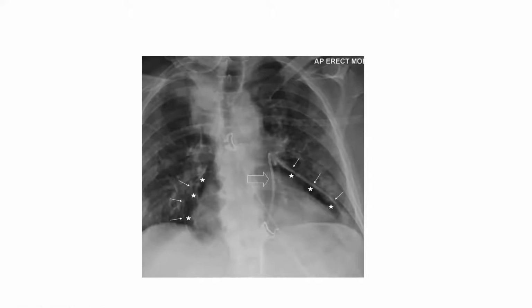So, ladies and gentlemen, anytime you lose my sound, please let me know, because I'm in a place where the connection is not stable. So, is my sound clear so far? Yes, it is clear. Okay. So the fluid goes dependently down by gravity, and the air goes dependently up. If you have air, it tends to go up. If you have fluid, it tends to gravitate down. That's why you have more air here than on this side, and of course, than in the inferior side of the heart. That's why this is air.